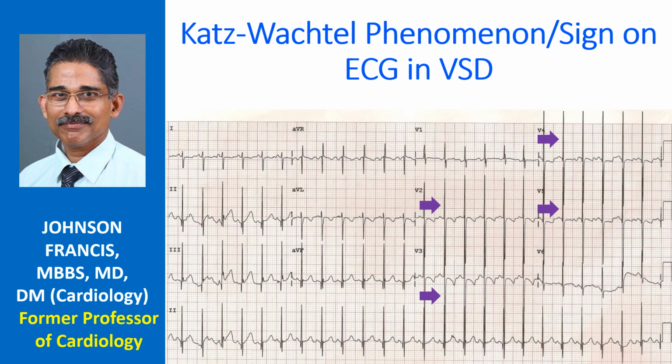The QRS amplitude is high and often overshoots the margin of the ECG graph, as seen in lead V4 in this case. It may be necessary to take the ECG in half standardization, that is 5 mm to a millivolt instead of 10 mm to a millivolt, to capture the full QRS complex without overlapping with other leads. Large anterior forces are due to the hypertrophied right ventricle and late posterior forces due to the hypertrophied left ventricle.